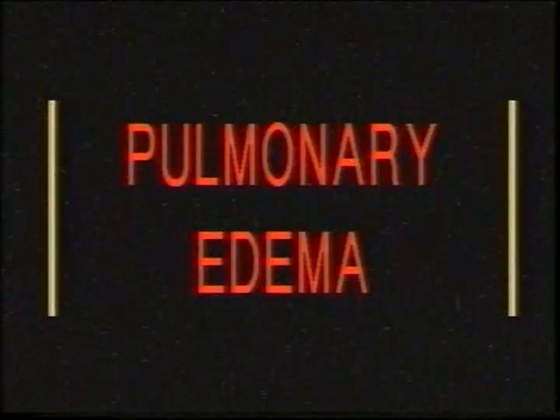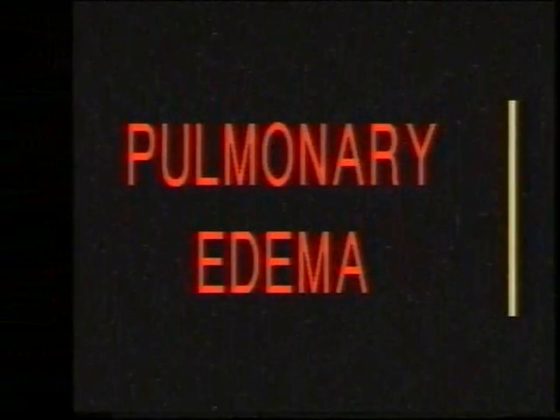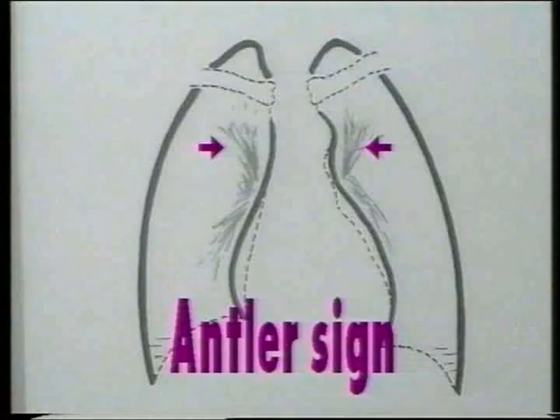Pulmonary edema. Pulmonary edema is a condition where there is left ventricular failure causing back pressure in the pulmonary veins and later fluid accumulation, first in the interstitial spaces and then in the alveoli. First, let us see the early changes. Initially, the upper zone vascular markings become more prominent than the lower zone vascular markings which are normally prominently seen. The branching upper zone vessels look like the horns of an antler and is termed as antler sign.